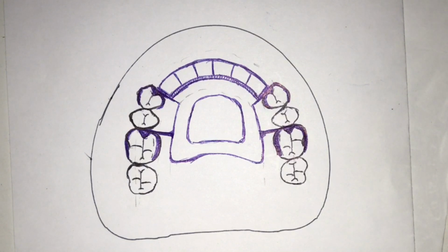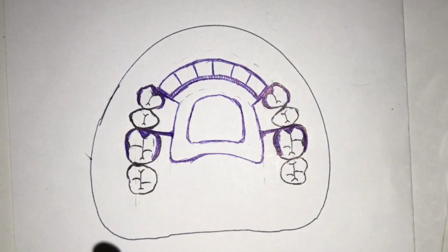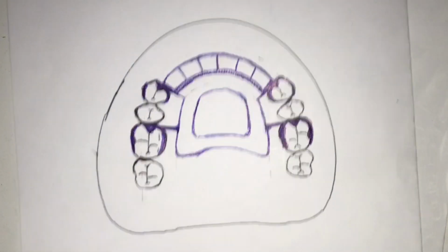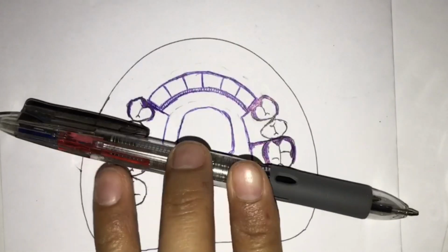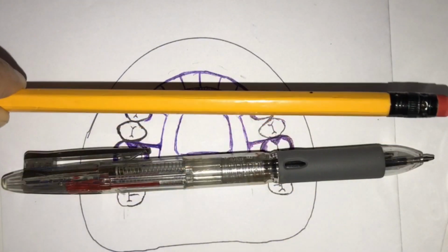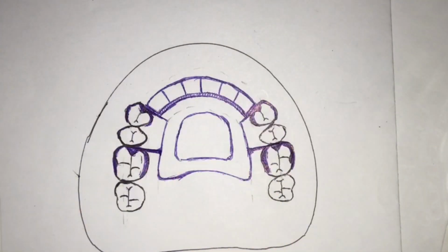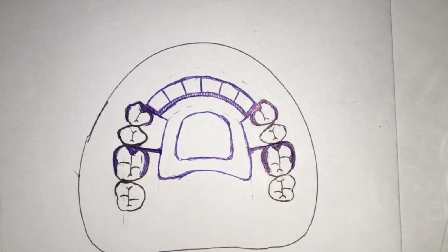So as to explain the principle, we know that the direct retainers, when it comes to a class 4, is always 4. Diba? As I told you a while ago, it's always 4. Why 4? Because imagine, if we're just going to place the rest directly on the abutment area, of course, it will tend to rotate. So it will rotate going there. It's going to rotate. So you need the aid of other abutment teeth.